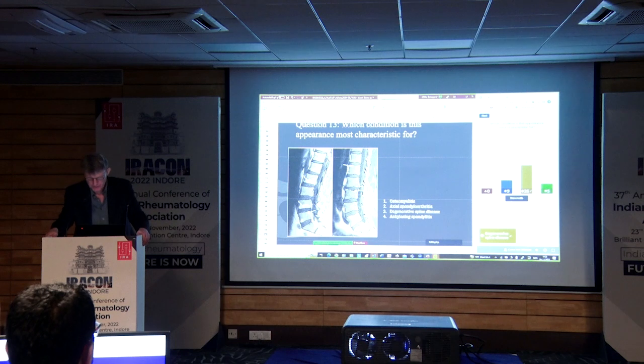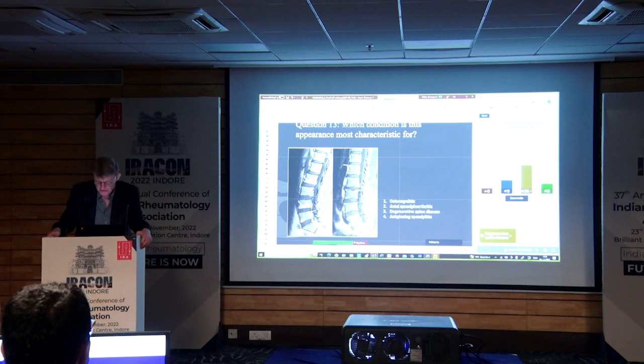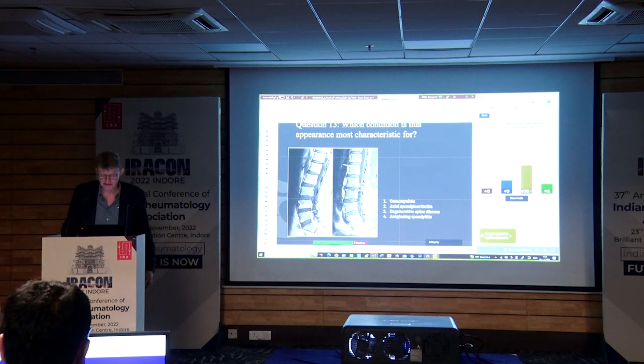Correct. Great. I'm happy to see that. You could say that most typical, this is definitely correct. It's a T1 weighted image, you saw it before, so it's fat infiltration in the corners and along the disc. But overall, it's mainly lesions that are, you could say, wider than they are high. And therefore, I would say that degenerative spine disease would be the correct answer.